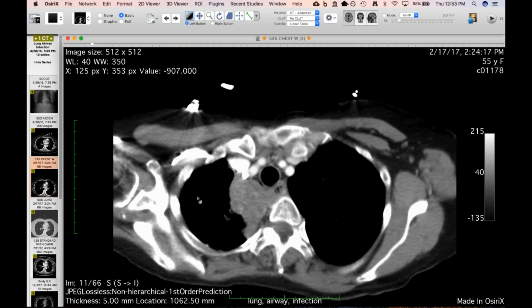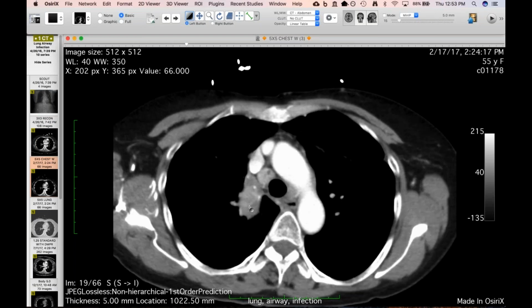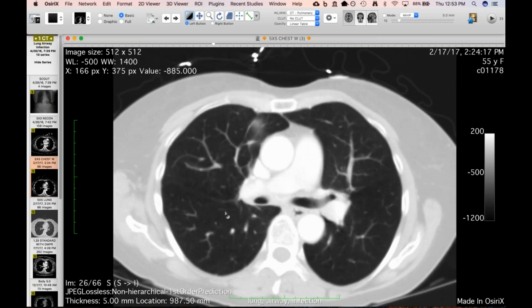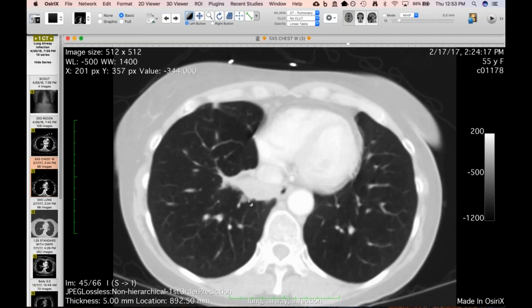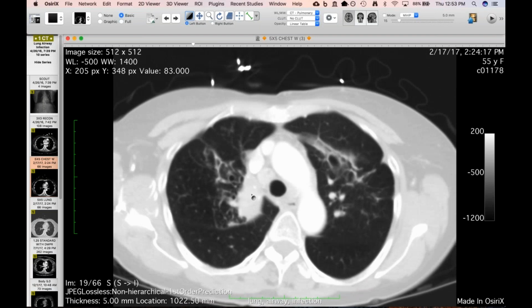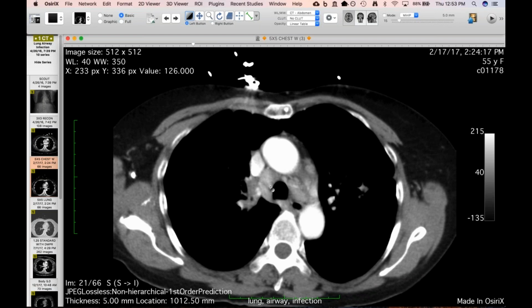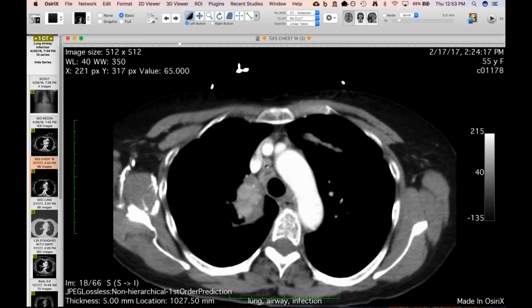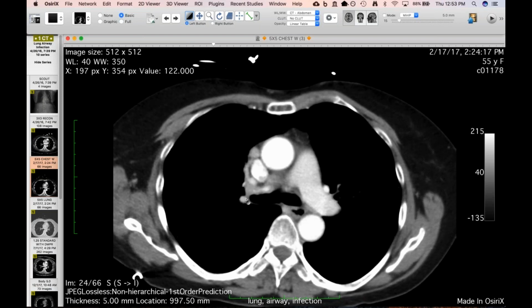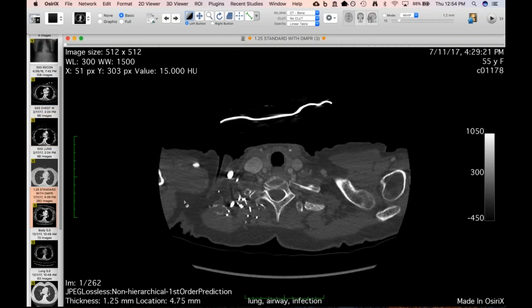She came back the following year and now has this thing in her right upper lobe, this more mass-like consolidation medially, which was in an area where she had bronchiectasis before. She still has this thing in her right lower lobe, although it's a little bit smaller. And this time they got a little bit more aggressive because this was still at an outside hospital. She had this right paratracheal lymph node. They actually did a mediastinoscopy, biopsy. They resected one of these paratracheal nodes and then also biopsied this and just got inflammation again in reactive nodes. So no cancer.